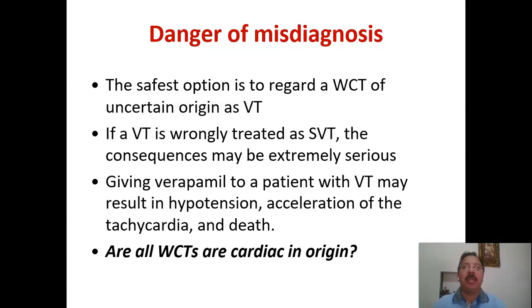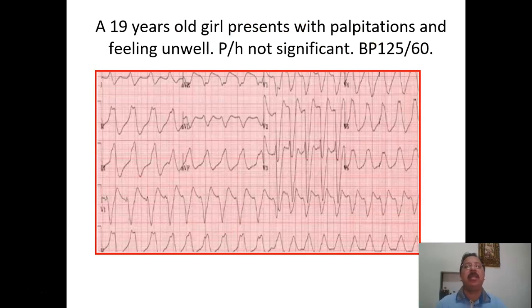So here the question is, the wide complex tachycardia we see in our practice, are all wide complex tachycardias cardiac in origin? Look at this ECG. A 19-year-old girl presents with palpitations and feeling unwell. Past history not significant and blood pressure is 125/60.